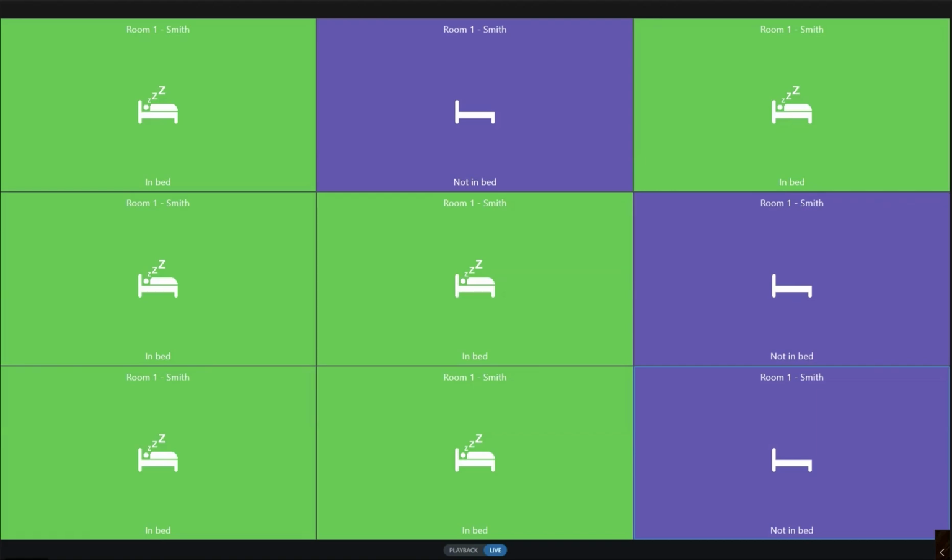I hope that provides you a quick overview of what we are able to do with the new healthcare solution, the MOBOTIX NurseAssist dashboard. This is a type of preview. It's used especially for sales demos or for pilots, and next year we will deliver the final release with a lot more functionalities in that healthcare environment.